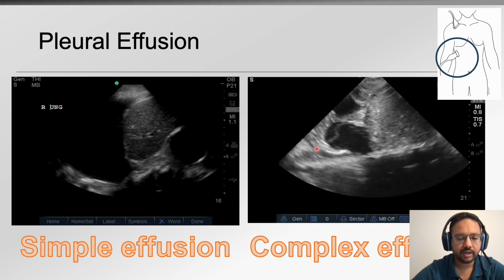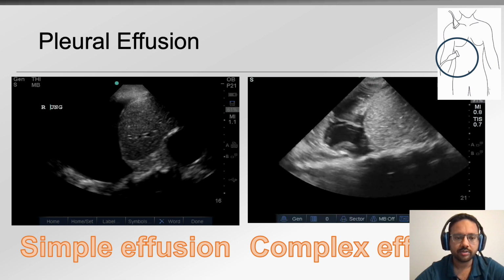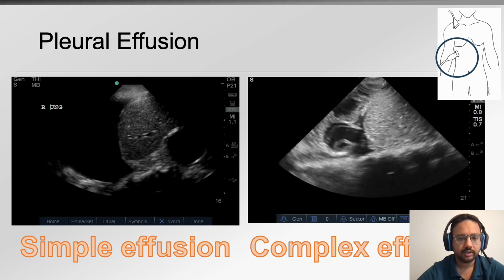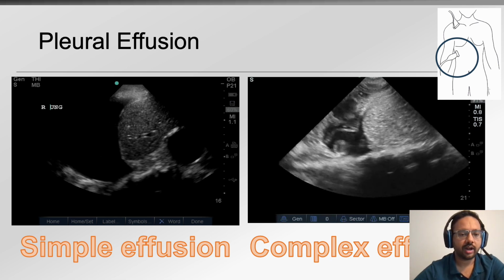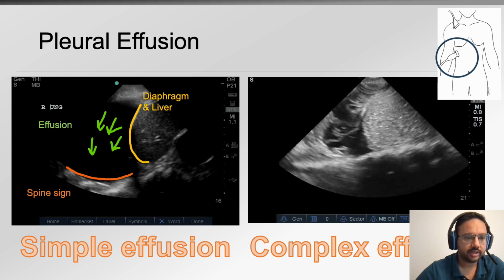When you figure this out or when you see this, it is important to pay attention to this, because this is not a patient that placing one chest tube is going to drain all of the fluid. Rather, it is a fluid collection that may require additional interventions. So pay attention to that.